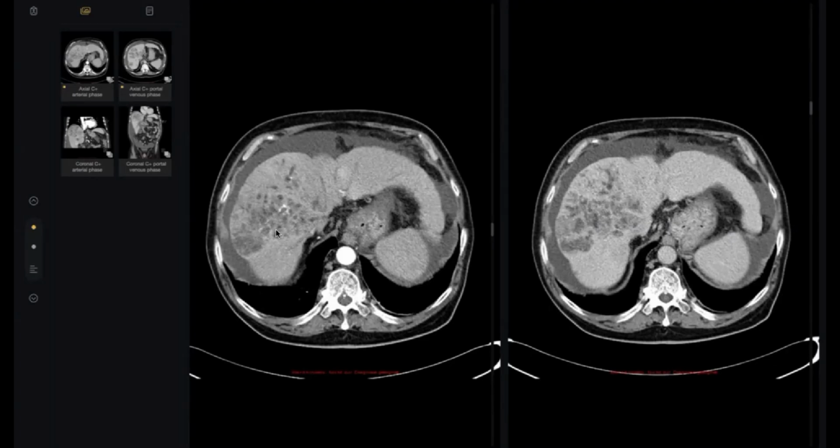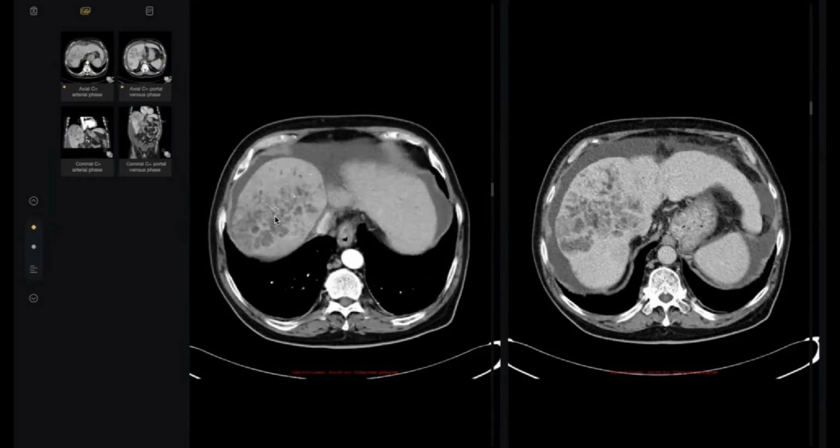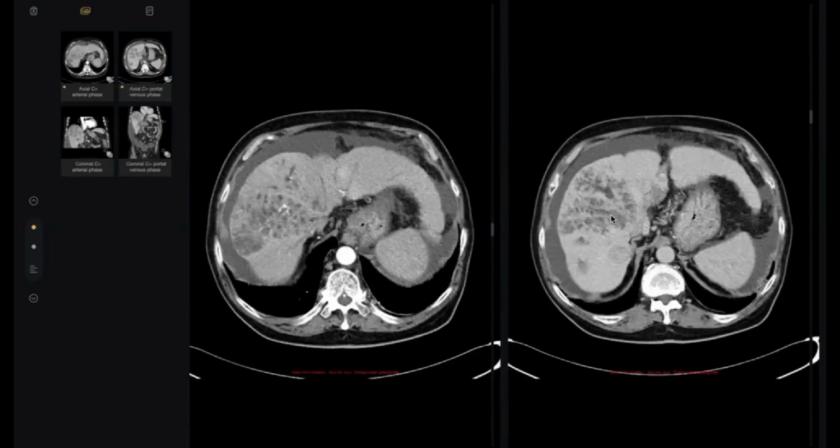By another term, there is heterogeneous contrast here, correct? Could you detect the contrast here or is it hypodensity? What is the name of this phenomenon? Washout. Excellent. So the lesion here enhanced, showing some foci of hyper enhancement, and then what happened here? Washout.